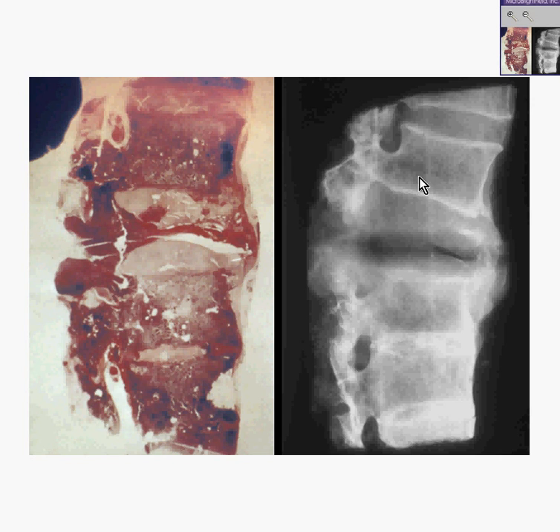Here's another x-ray view of some vertebral bones in which you could see there's destruction of the bone and replacement by this whitish type of tissue. And even in the adjacent vertebrae, you can see that there's lysis as well, which corresponds to these whiter areas.